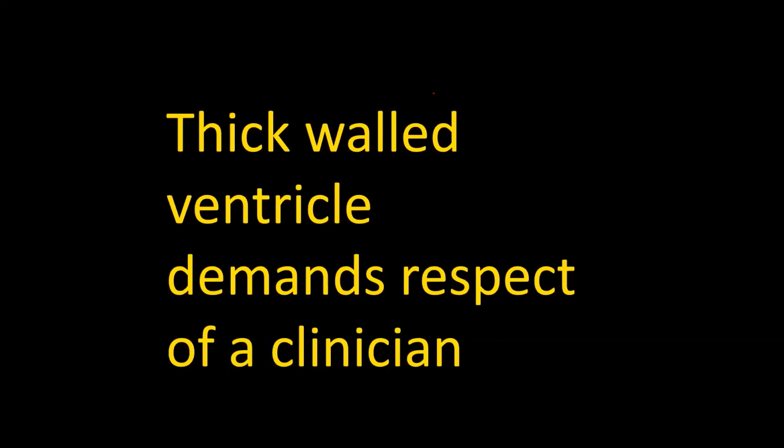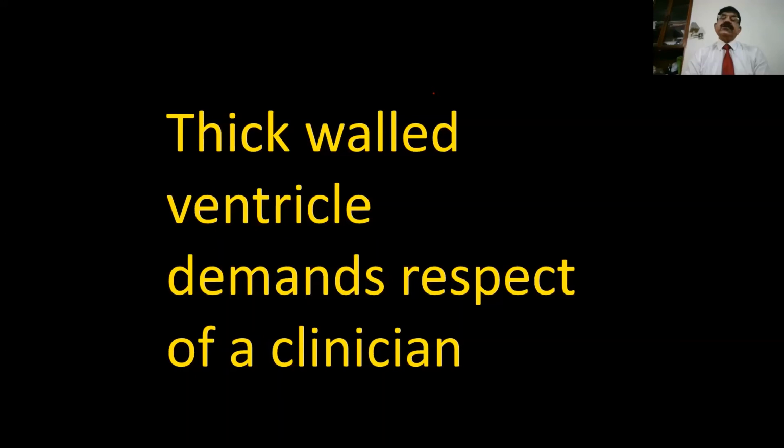If other segments are shortening and the global and longitudinal strain is negative, these segments actually get stretched and the longitudinal strain becomes positive here, and vice versa. This is called paradoxical left ventricular strain. It was initially described by Ted Abraham at Mayo Clinic, I think in 2002, and then there was our paper.